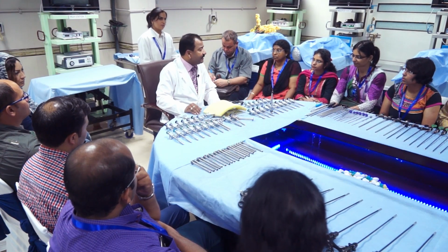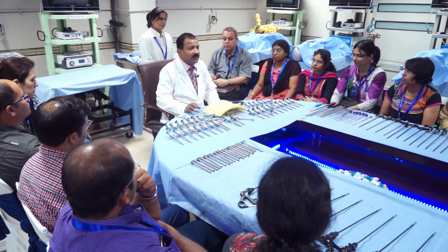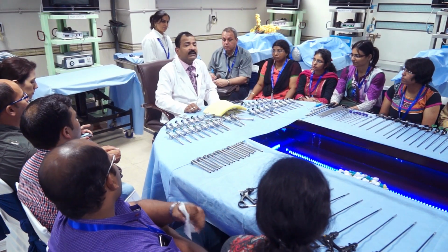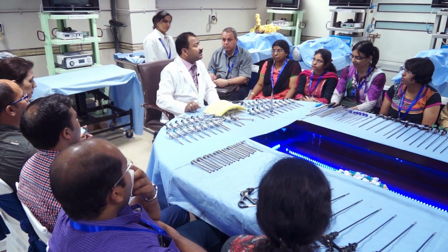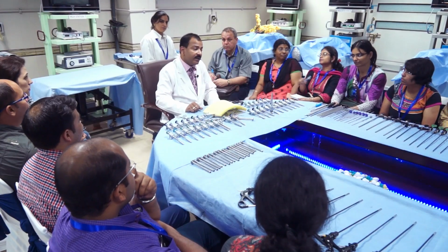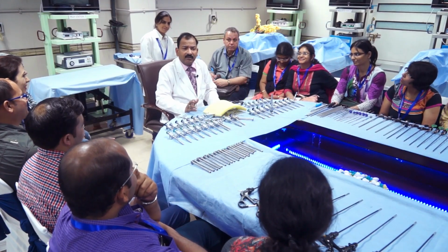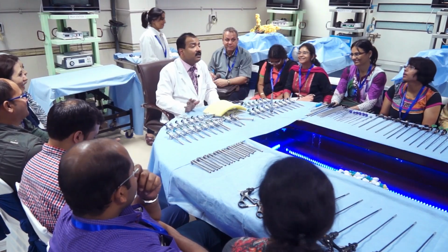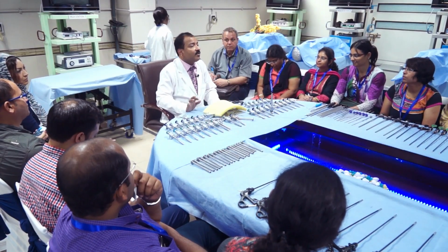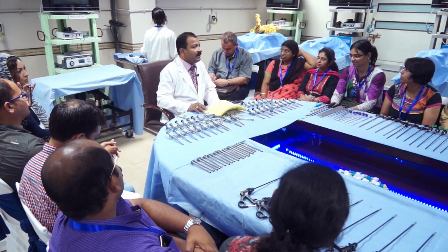You cannot write anything if I tell you to write at 120 degree. It is not possible. Now, the only option is that you know where the port should be. That also, unfortunately, we do not know. You will ask your consultant why you are putting the port here, they will say it is good. If you put the port here, you can do better. Then you will ask why can I do better? Then they say no, it is good. This is not the rule. There is a rule there. There is a principle that is called the baseball diamond concept of port position. This is a discipline which you have to respect.